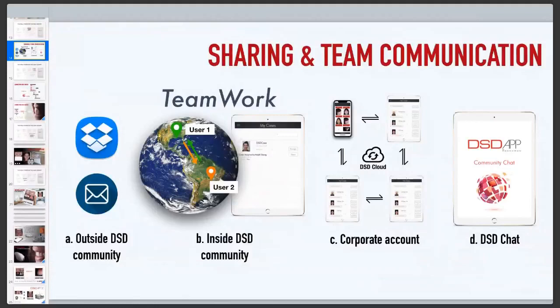Another important thing is the chat. Inside of the app, we have a chat, I would say like a WhatsApp group, right? So you can create case discussion groups, you can share photos and messages, and keep all the files for that patient stored in one place. If you'd like more information about this, please check webinar number 3.